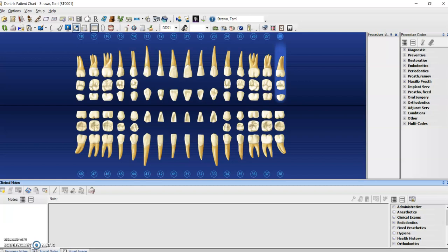is an upgraded software, so there are a couple new buttons that we didn't have previously. So up at the top here, we have the DDX button, Guru, and we have the Marketplace. All those are new. We won't really be using them in this course. It's just something that looks slightly different.